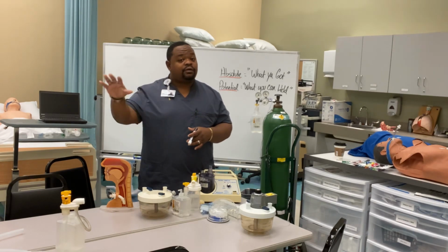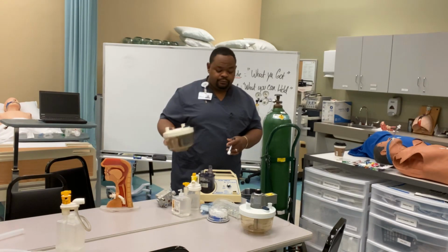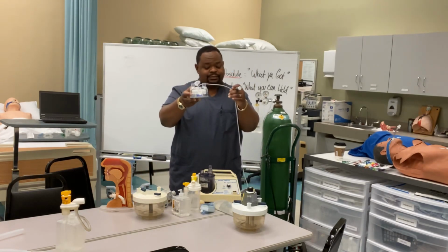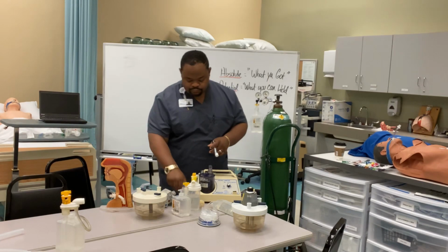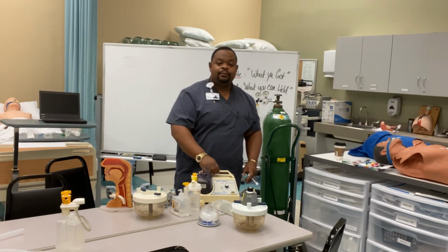They produce aerosol. And then the humidifiers, which are the Passover, the Cascade with the feed apparatus, right? I showed you the HME, heat moisture exchanger. And then I showed you the ultrasonic nebulizer, right?